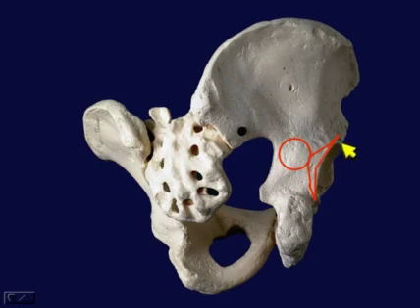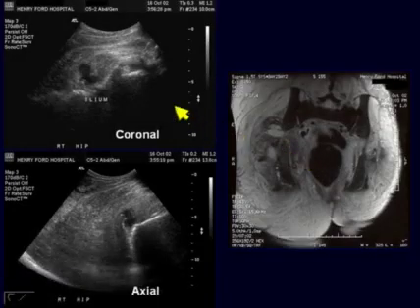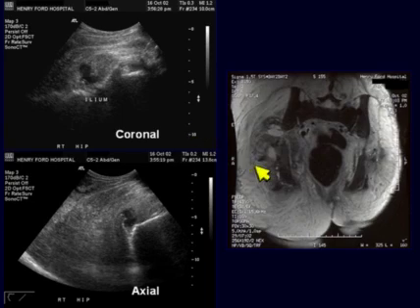We could readily detect the bony acoustic landmark of the posterior acetabulum and an abnormal collection of mixed tissue right posterior, or immediately posterior, to it. So on ultrasound, therefore, this is what you're going to see. But first, since we already oriented you on MRI, let's again start with that.